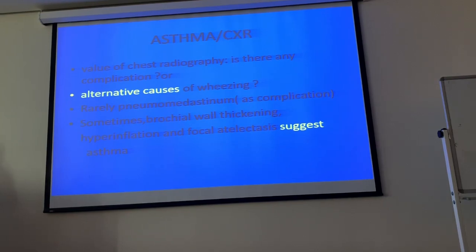And focal attenuated changes, actually, if you see a hyperattenuation or whitish band, but you don't follow it like a vessel going towards the hilum, that is a linear atelectatic change. Sometimes we call it plate atelectasis because it looks like the edge of a plate.